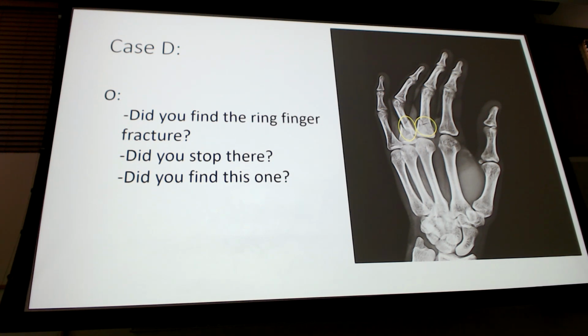But I like that you guys are looking at other things. And let's say this happens on a test. Let's say this image is the only one you get, and one of the choices is second, third, and fourth, fracture. And that's the wrong choice, but then we go over and I look at it and go, okay, I can see how that could be interpreted.